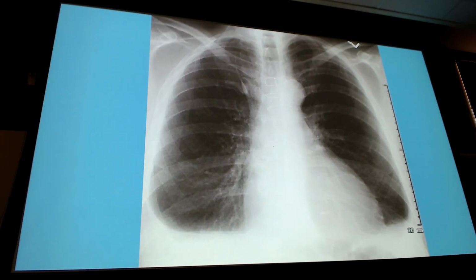Now you guys found, as a class, the four major abnormalities on this chest x-ray. So that's good. That's the kind of stuff you're going through and looking at. And just for funsies, even though we got the costophrenic angles and the blunting, let's take a look. We said cardiomegaly. So I have cardiomegaly. What do I need to know as far as my inspiration goes? I need to see what?